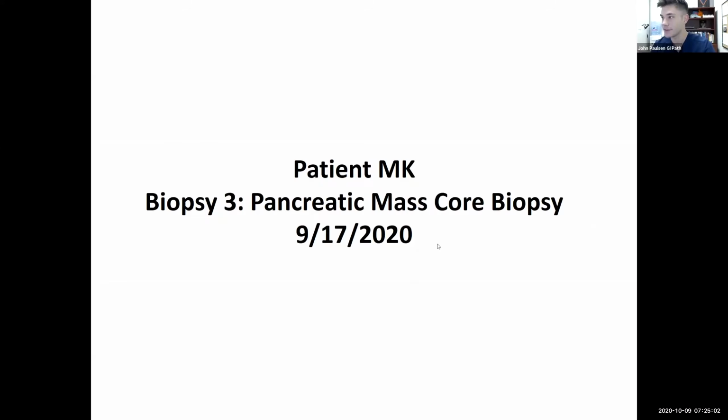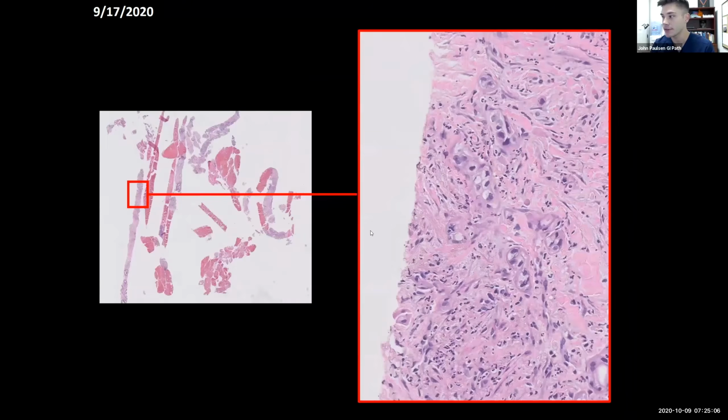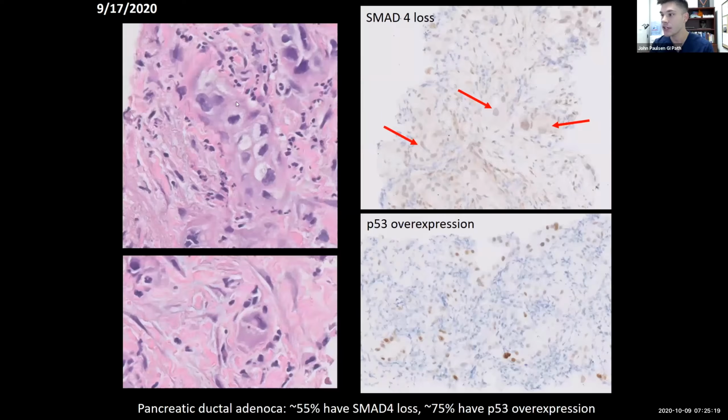All right. So this is the third biopsy in its entirety. And when we take a look around, we see here some very atypical cells. They're irregular nests, and the stroma is desmoplastic, has this hazy blue look to it. And the cells are very atypical. Looking high power, we see the atypical nature of the nuclei. They're hyperchromatic and squished. And the cytoplasm is also atypical, very foamy. And there's some single atypical cells as well.